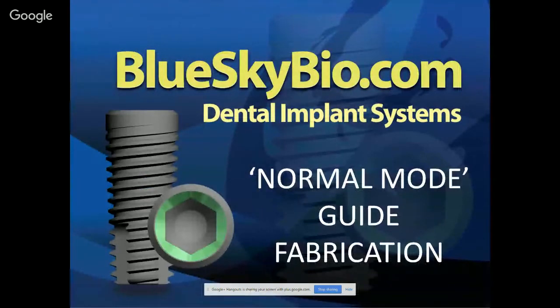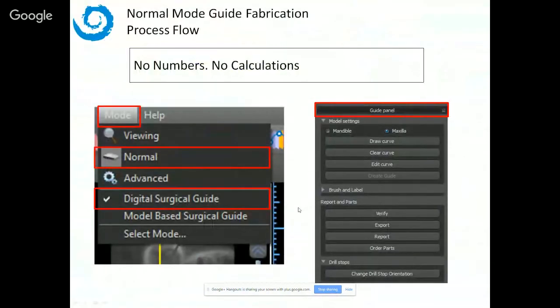Okay, so now we're going to jump into the process flow, the step-by-step for the normal mode for guide fabrication. When you load the software for the first time after you install it, it asks which mode you want to operate in. Irrelevant of that, you're able to change the mode by going to the mode drop-down menu and choosing normal or advanced or whatever you like.